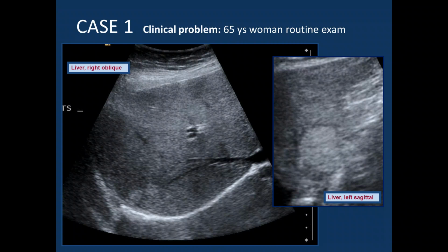So just think what's going on here. Do you see findings which could be of concern, and what would be your suggestion? These are simple and common diagnoses, but in this case not that easy. So the first idea is this could be a steatosis of the liver. Yes, of course, that's a very good suggestion. And are there other suggestions? Another suggestion is focal nodular hyperplasia. Then we have a third one which also goes for steatosis.